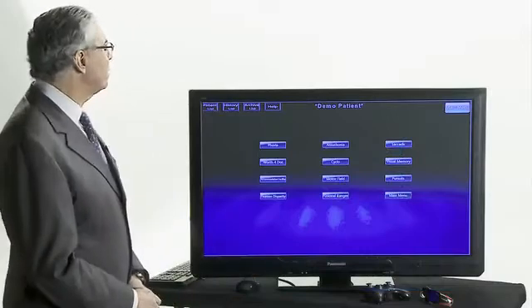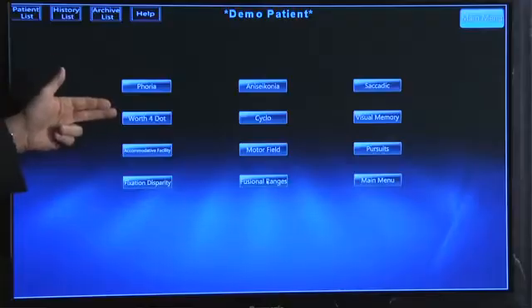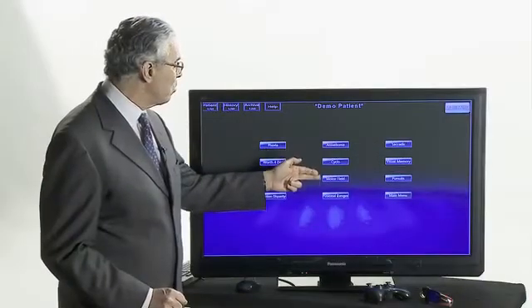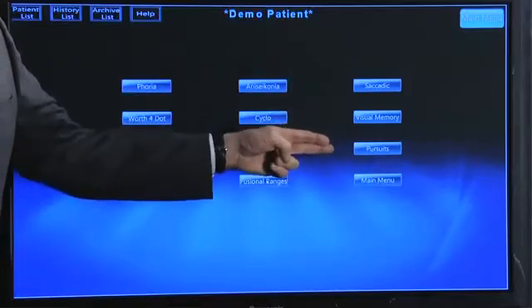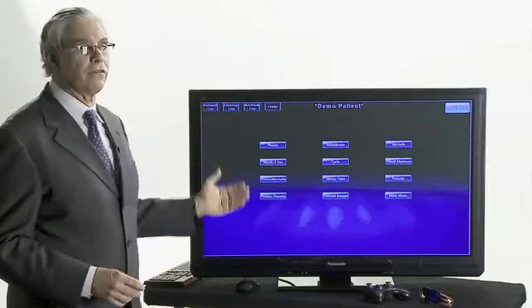The diagnostic package allows the ability to measure various groups of eye function, from phoria to fusional ability to fixation disparity, aniseikonia, cyclodeviations, motor fields, fusional amplitudes, saccadics, visual memory, pursuits. One of the chief advantages is that through one menu, you can reach all these different visual functions to test.